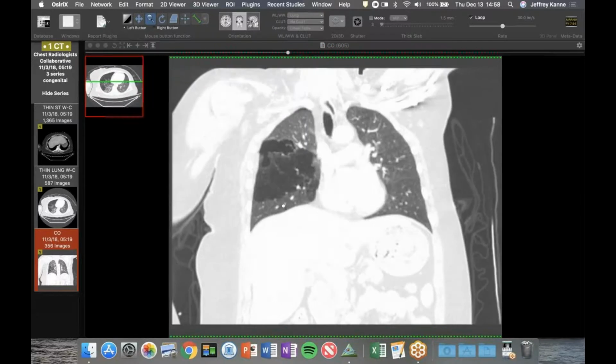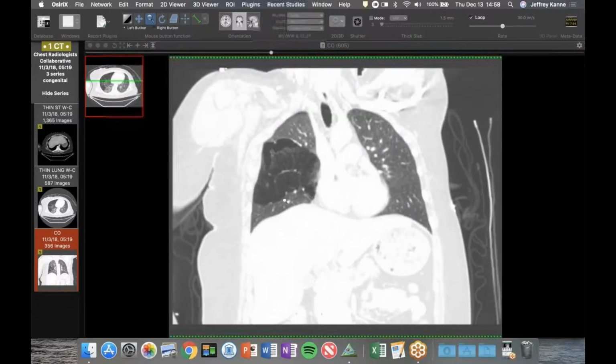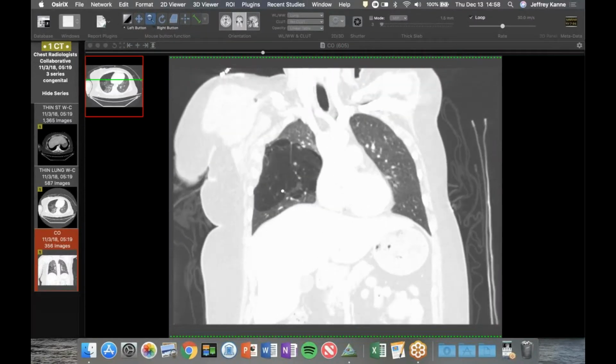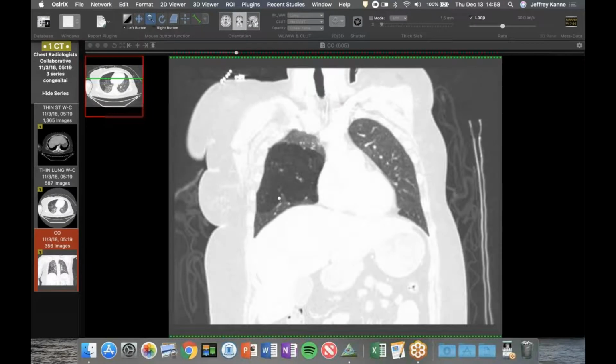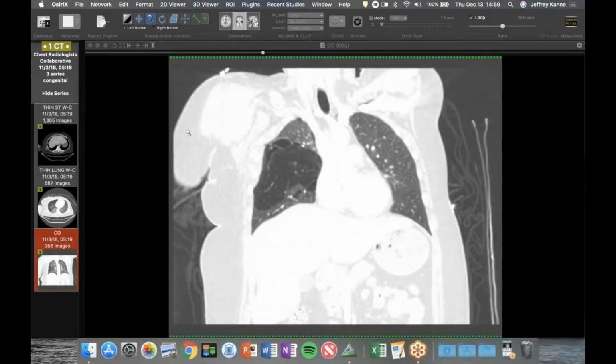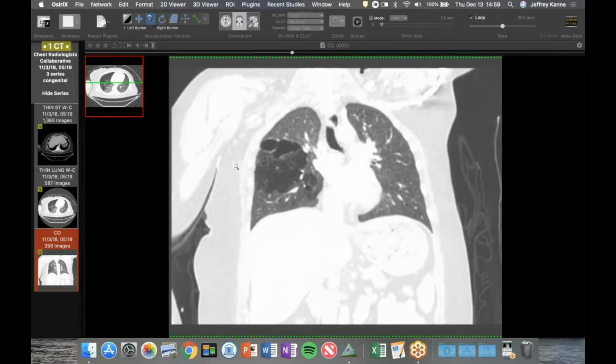But I would call it, I think it's all three. I think it's bronchial atresia that led to abnormal lung, and because of it you get the CPAM, but some of the lung was structurally normal, it's just overinflated. But this was, I can't remember how old, 40 years old, so incidentally detected.